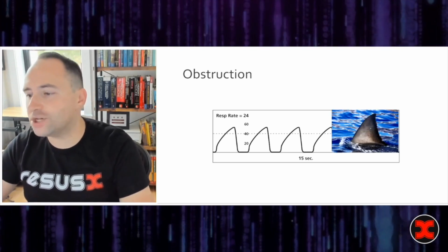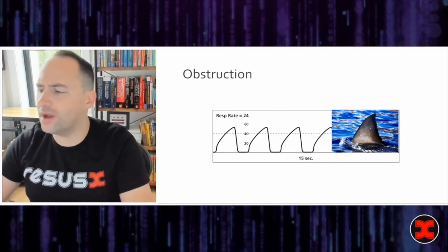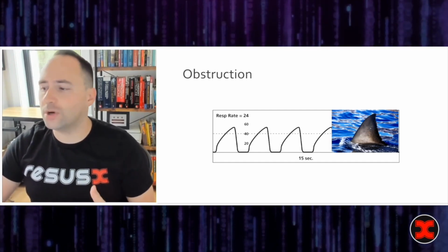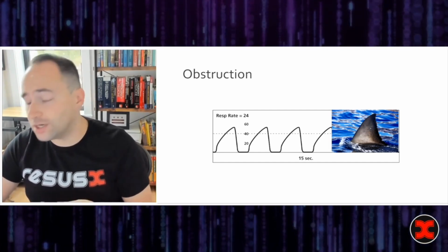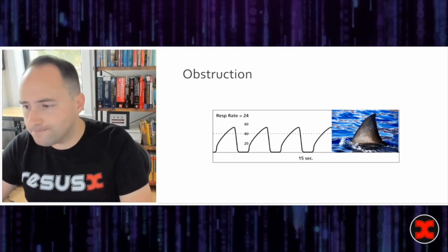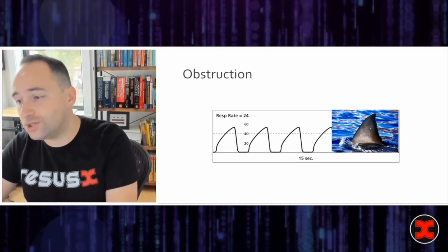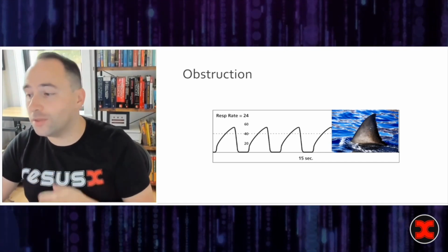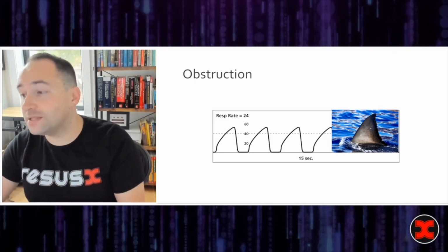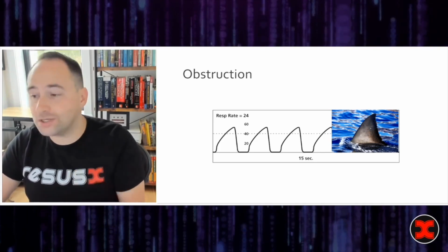All right, so this is the classic shark fin appearance of obstruction, and this carries a relatively broad differential. Commonly we think about bronchospasm, but other obstructive causes such as obstruction of the endotracheal tube or insufficient expiratory time should also be considered. Note here that the slope of phase two is quite prolonged. Remember that we call this the transitional phase. A prolonged transitional phase represents that the dead space isn't even empty yet before the next breath starts.